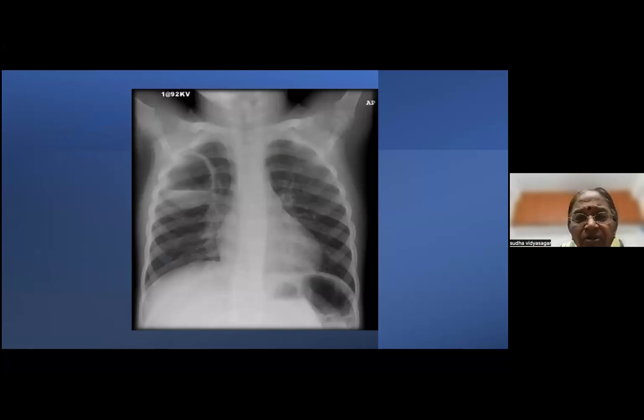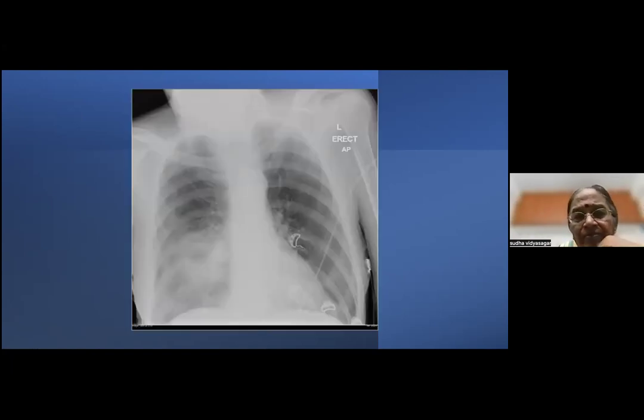That's a little more straightforward, correct? That's your lung abscess. That's what you're all talking about, right? That's a lung abscess, nice fluid level. You won't call it tuberculosis, correct? You would call it a lung abscess. Okay, fine. So this is a nice upper lobe lung abscess, beautifully seen. Okay, and this you can go with your usual organisms. Okay, Klebsiella, staph, Streptococcus sometimes, or anaerobic organisms. You can go on like that. Okay, fine.